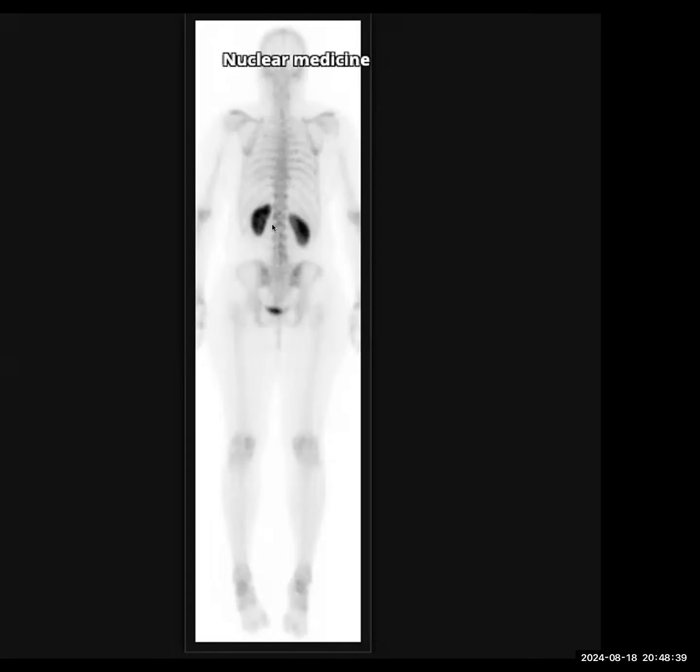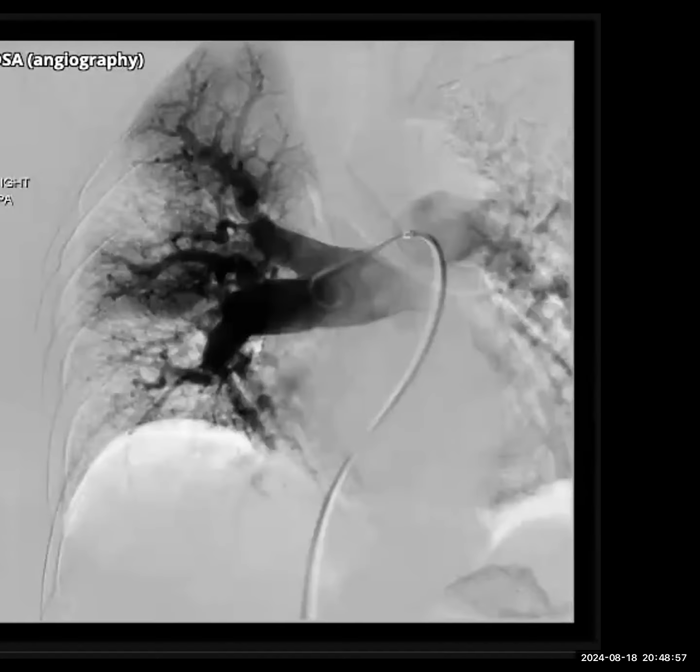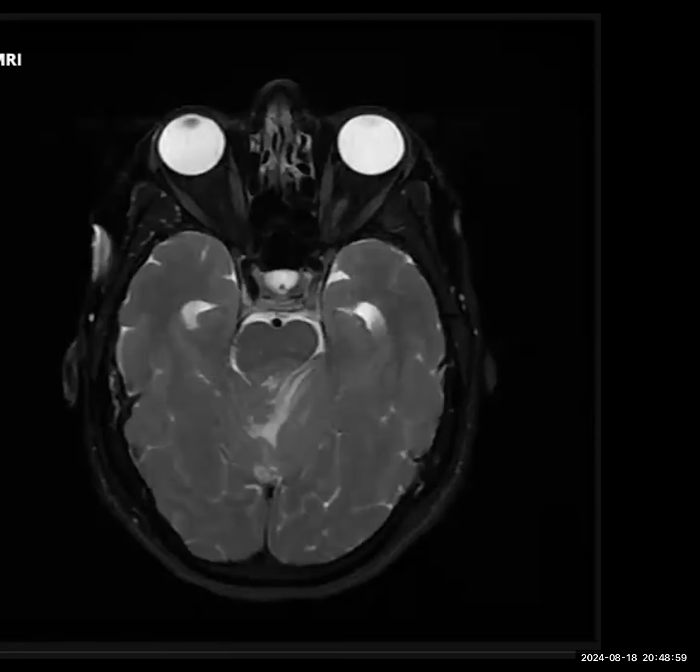So this was a case of hot kidney sign, which is commonly seen with a few conditions like acute tubular necrosis, or when you use nephrotoxic drugs, or in case of sickle cell anemia, hyperparathyroidism and hypercalcemia. That is why I gave you a history of bone pain if you were thinking along the lines of hyperparathyroidism. Okay, I think that's it.